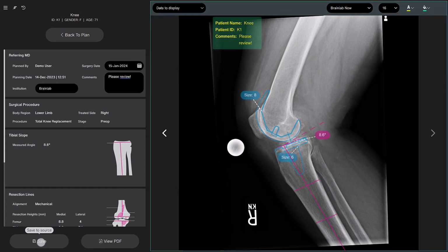This marks the end of the TraumaCad Neo planning procedure for total knee replacement. Hopefully you found this video beneficial.